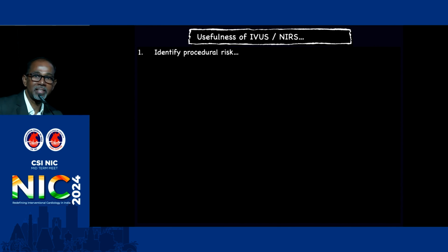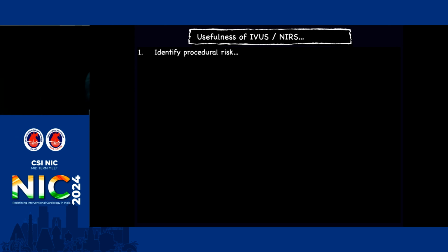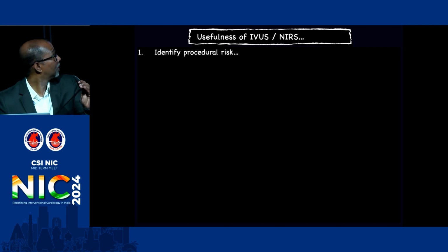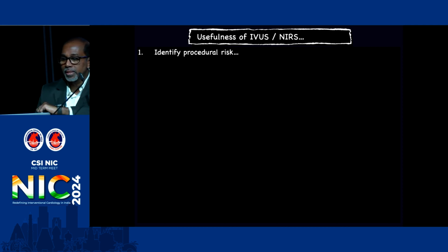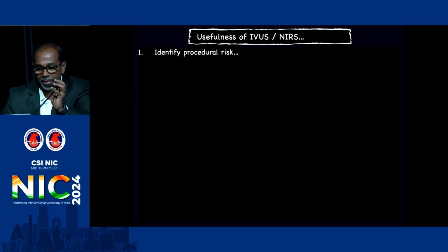Over the next 10 minutes, I shall share with you a few of our interesting cases which were helpful in decision making during our interventions. The first case is regarding the usefulness of IVUS NIRS in routine practice. It helps to identify the procedure risk involved during an intervention.